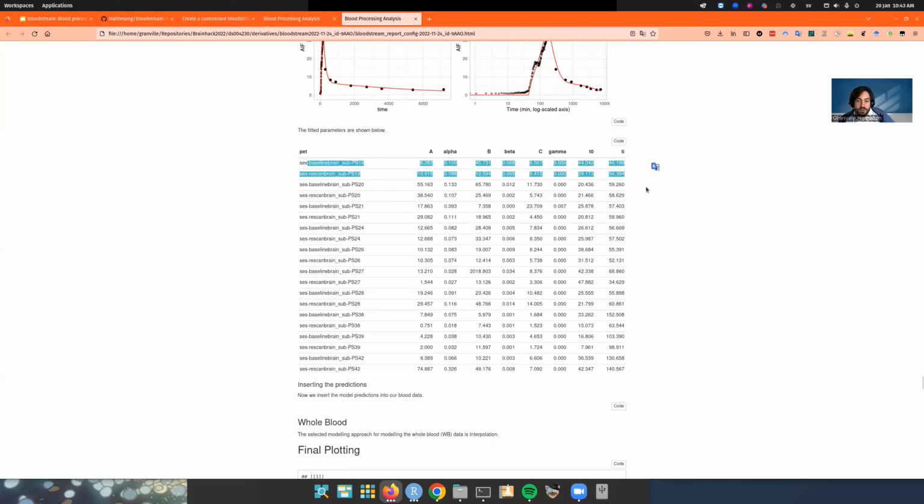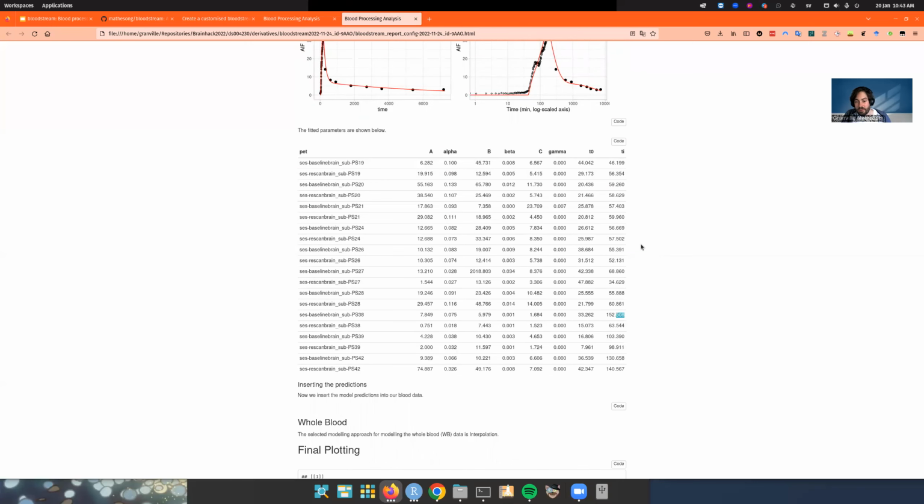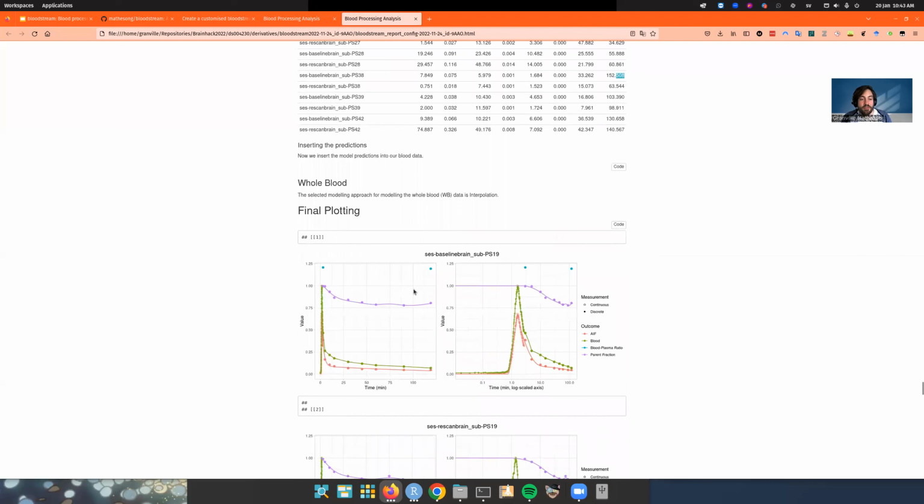So we're fitting our infusion time values. As I mentioned, the infusion, that's TI, that's the parameter. As we mentioned in the paper, it said that the infusion time was about 60 seconds for each of the measurements. As we can see, we have 56, 59, 58, 57, 59, 56. So our model seems to be doing a really good job, actually, in most cases, of estimating the length of time for which the infusion took place. A couple of these look a little bit awry, 152. But if our curve is good enough, it's probably not going to make that much of an impact.